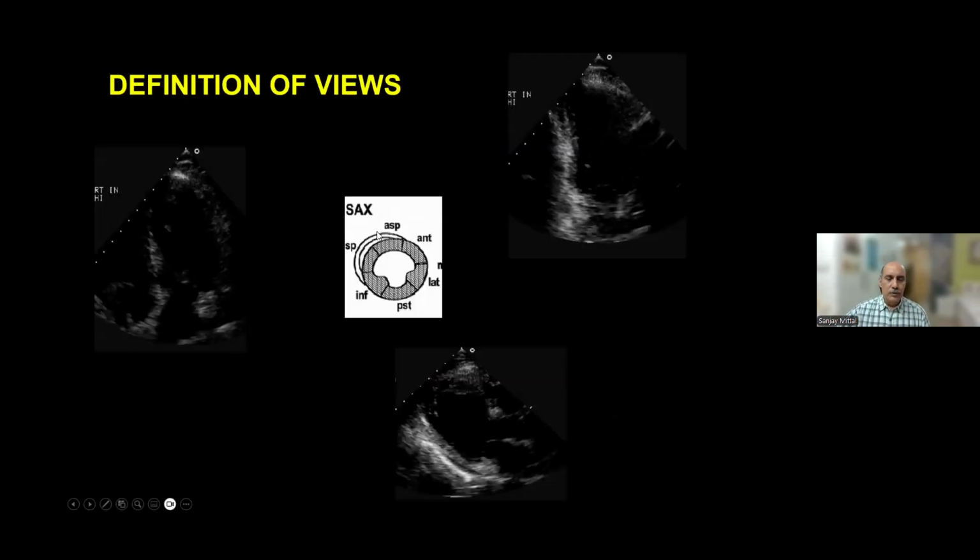So as I was trying to analyze and explain to you, the anterior interventricular groove is the position we use as a cutoff point for the right ventricular insertion point. Anything beyond it on the lateral side is the anterior wall. The medial side towards the septum would be the anterior septum. So anterior wall and anterior septum. This is why it is written ASP.